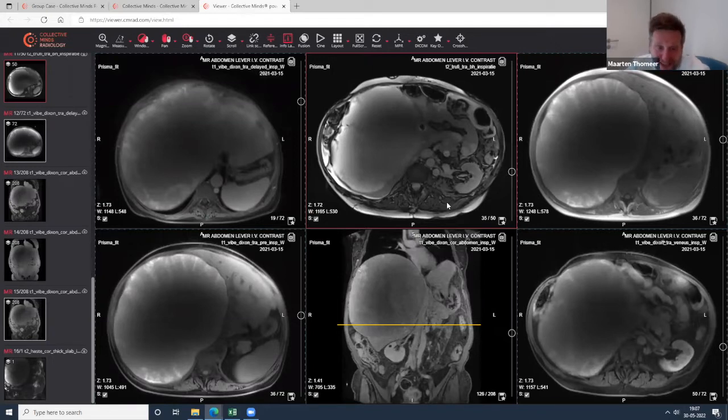So I made here the diagnosis of a simple cyst that has bled, and there's no reason for resection, in my opinion. Fenestration would be enough. So that's my opinion on this case. And then I would say, Maarten, you are absolutely right. This is a pathologically and surgically confirmed hemorrhagic cyst. And they did fenestrate the cyst.